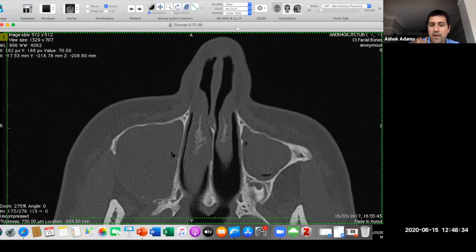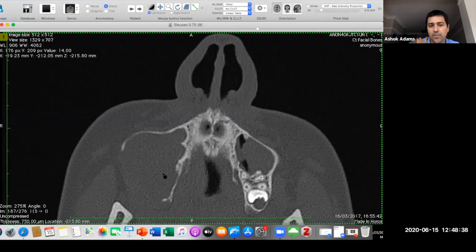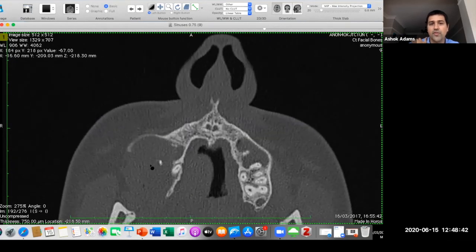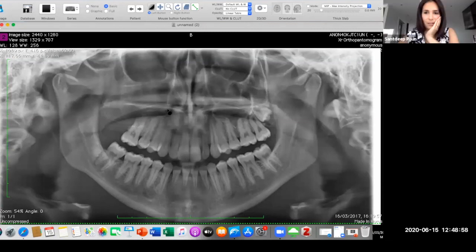Be very careful about some of the opacified maxillary sinuses. They can be secondary to dental problems, as in this patient, who had a dental extraction and a residual cyst that gradually got bigger with time. I'm no OPG expert, but that's what you see. This was the opacified sinus, and that residual cyst had got bigger and bigger and they had right-sided facial pain. Does that help? Thank you, that's brilliant.